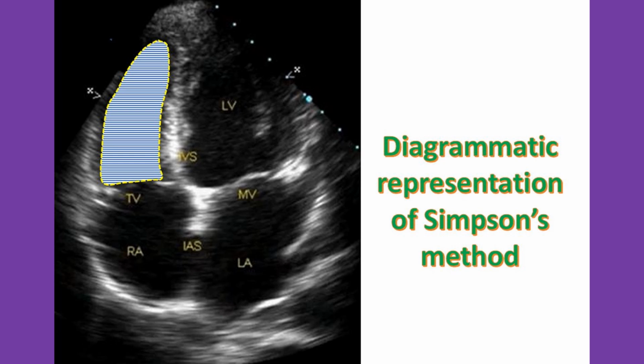Right ventricular ejection fraction can be calculated using Simpson's rule. Right ventricular outline is traced out in systole and diastole as for left ventricular function evaluation by echocardiography from the four-chamber view. It has been shown to have prognostic value in heart failure, valvular heart disease and congenital heart disease. But it is highly load dependent and can be inaccurate in volume and pressure overload states. Precise measurement of right ventricular ejection fraction is often difficult due to the complex geometry of the right ventricle. There are several limitations due to the geometry of the right ventricle.